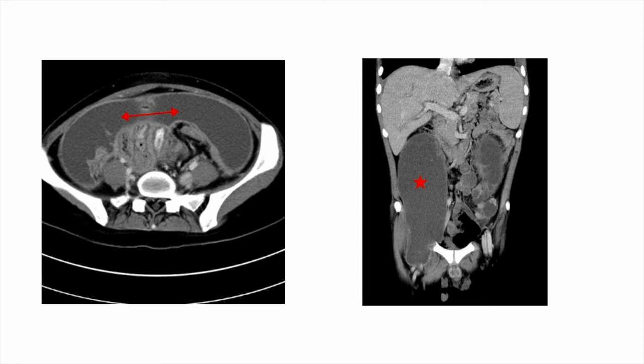You can see calcification within the kidney, and sometimes you can also see the ureter calcified, but it's more common in the peritoneum. Here in this part of the world, it is more common in the peritoneum. In Ghana, we see a lot of cases with this kind of tuberculosis manifestation. So whenever you have a patient with ascites, you always think of this tuberculosis infection.